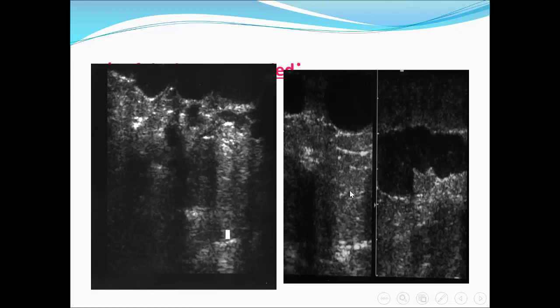Breast metastasis occurs in 4% of cases, so don't miss, usually from adenocarcinoma or malignant melanoma, and this case was an adenocarcinoma metastatic to the breast. There were axillary nodes, and because it's blood spread, it comes also subdermal in location, so this is a case of breast metastasis.